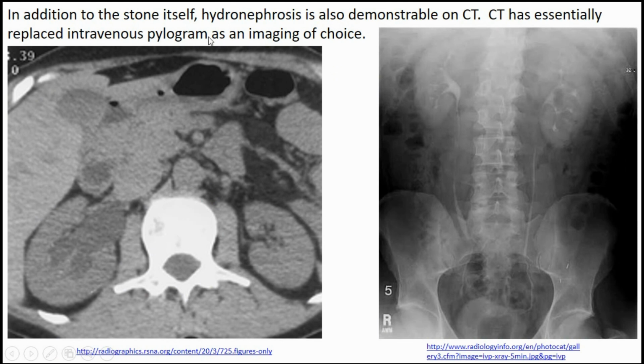So hydronephrosis is also something we can see on CT, but also on ultrasound, and we'll have a whole little slide on that in just a moment. But hydronephrosis, possibly caused by a tumor of the ureter or blockage of the ureter by a kidney stone, is backing up the urine into the ureter, the renal pelvis, and all the way back into the kidney. So right here we have the left side of the body, normal. Here's the right side of the body, and you can see that ballooned out area where the urine is draining. So there's some blockage somewhere.